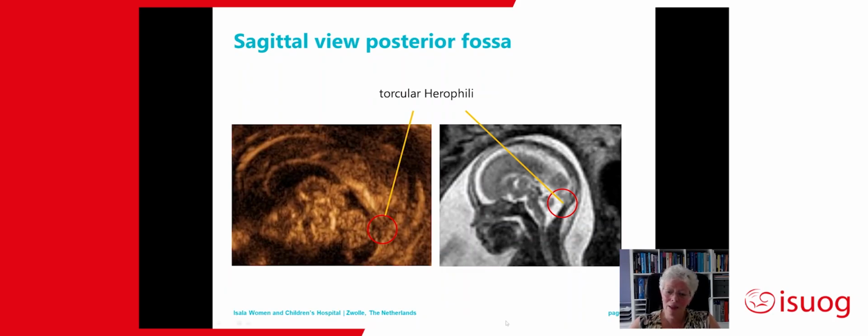And here in this fetal MRI, we can see that there we have the insertion of the tentorium, and on the outside of the skull we can see the insertion of the neck muscles, which can help us to see if the point of insertion is normal.